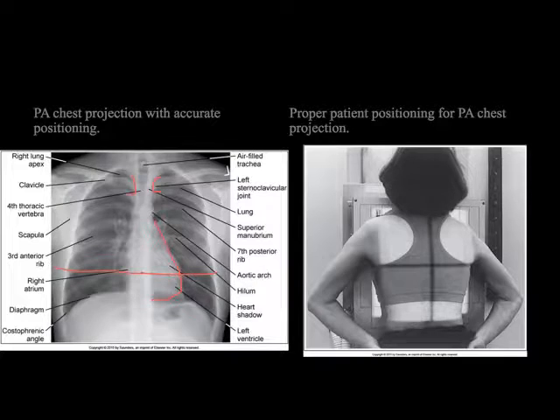One thing I've pointed out at a few other times is that technologists tend to put their markers face up on the board, and anytime we're shooting PA, that's going to project the marker backwards when we display it for viewing. So you can actually put your marker upside down on the board when you're shooting PA in order to get it to display correctly. And we don't want to see any foreign bodies. For exposure, we want a sharp outline of the heart and the diaphragm, and lung markings. If we can see these fine lung markings throughout, that's helpful.